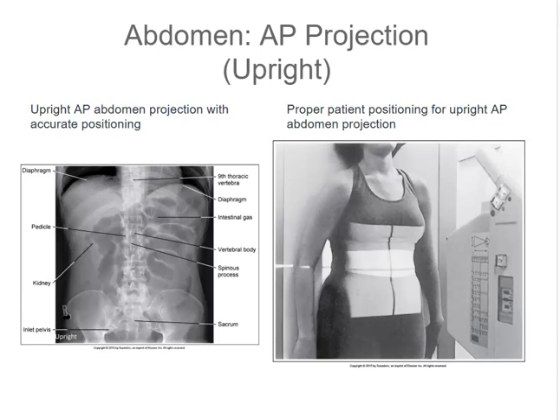Spinous processes should be aligned with the midline of the vertebral bodies with the pedicles at equal distances from them. Again, the iliac wings should be in symmetry. The sacrum should be centered within the pelvic inlet and aligned with the pubic symphysis. The long axis of the vertebral column will be centered on the projection. The third lumbar vertebra or the fourth, depending upon protocol, will be at the center of the exposure field.